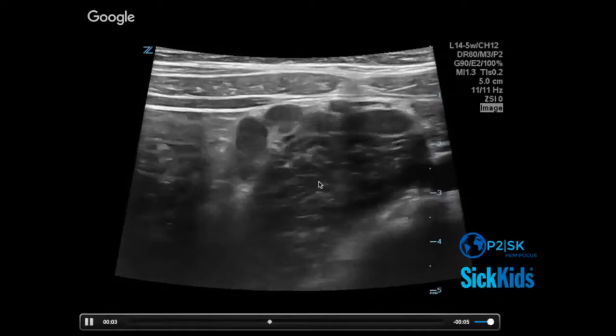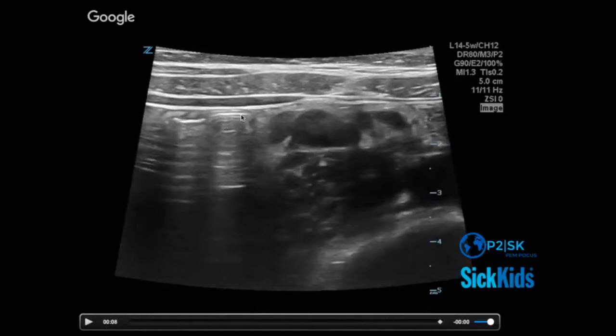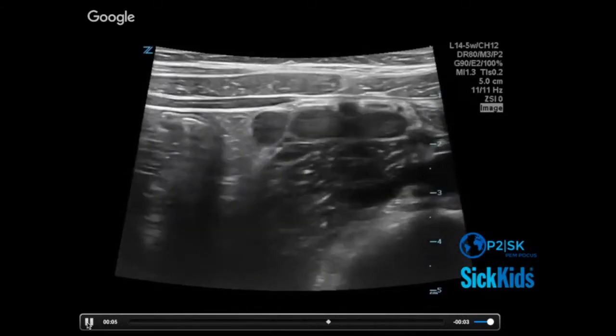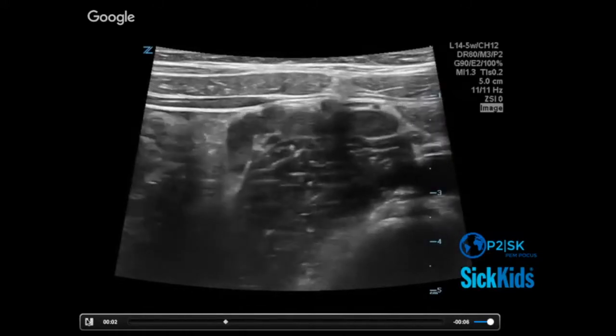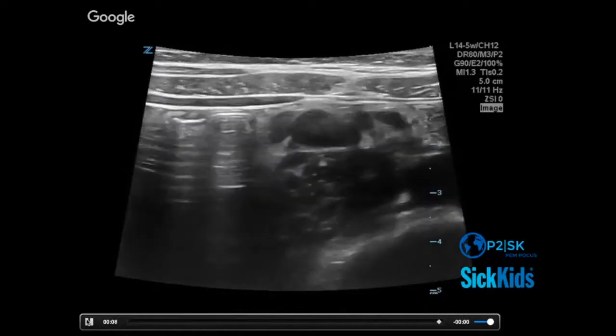Okay, what's this? Awesome. This? Fine. Okay. This here? Nice. And do you guys see the appendix? Okay, good. Lymph nodes. It's not that common to see these size lymph nodes lying over the psoas, right? With this little rim of hot fat around some of them, that makes you more convinced that instead of lymphadenopathy, maybe this is lymphadenitis. So that would be an example of finding mesenteric nodes, which could be mesenteric adenitis on its own, or could be connected with appendicitis.